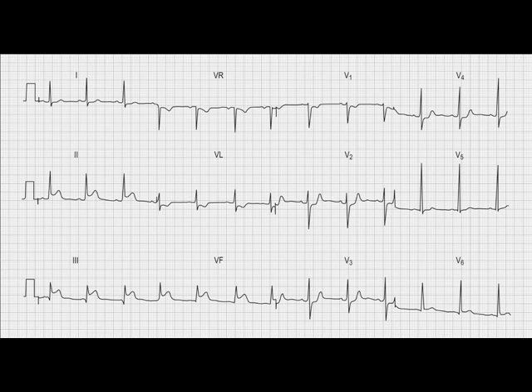So now you've been champing at the bit for me to look at the abnormality, and certainly if you look at leads 2, 3 and AVF, you're seeing a blurring of the QRS complex with the T wave. That's the ST segment, it's elevated. And many of you watching and listening will know, with a good clinical history and with biochemical markers such as troponins, that is indicative of a myocardial infarction.